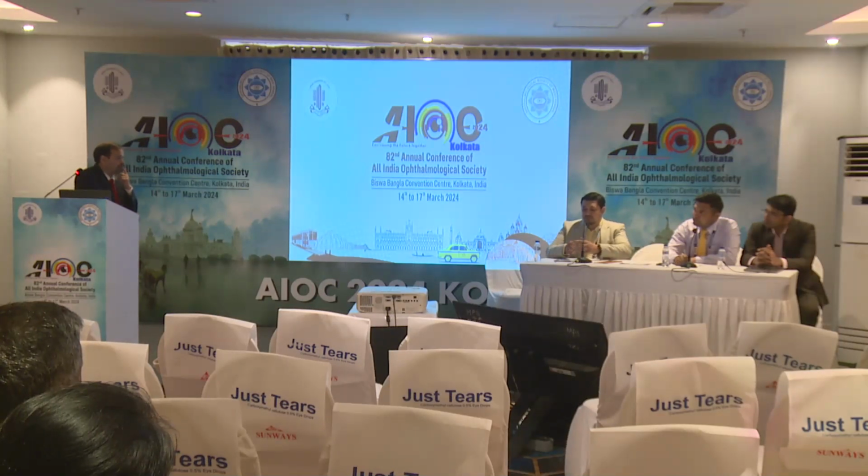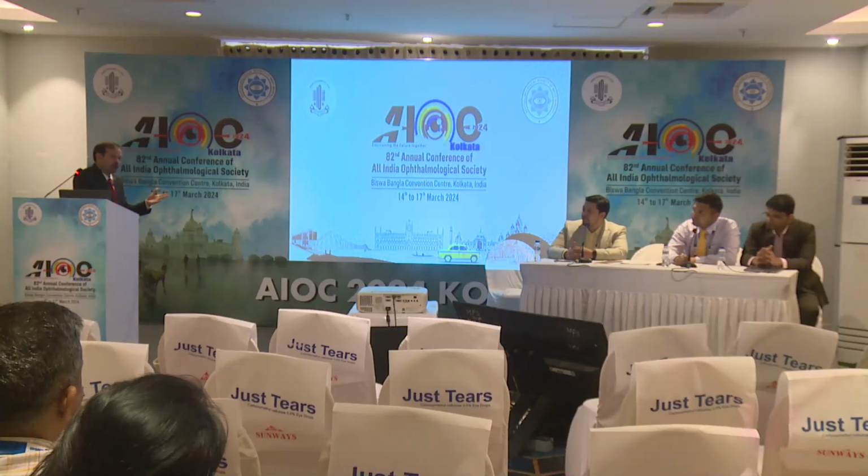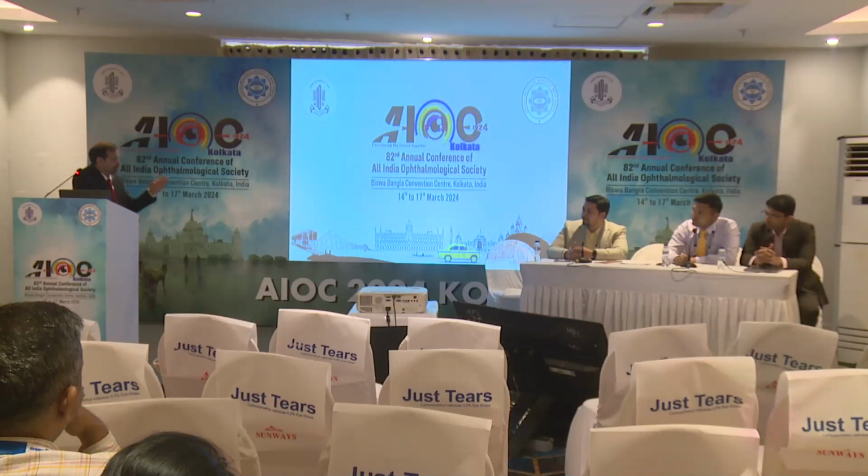But it does show some insight as to what is happening in the pathogenesis of diabetic retinopathy. We always knew that diabetic retinopathy is a vascular disease, but now we have evidence which shows that a neurological component is going on simultaneously. With OCTA-like tools, we can show that even the vascular changes happen before the clinical changes. So in future we are probably going to look at a treatment which retards these changes and possibly nips diabetic retinopathy in the bud before it comes up clinically. But as of now, it does not change your management at all.